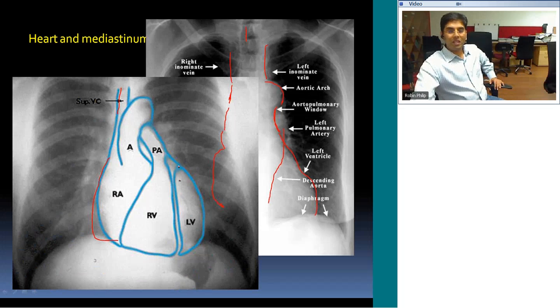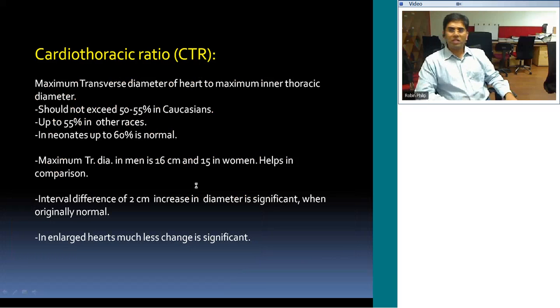Unless it is enlarged, we cannot make that out. The left heart border is formed by the left ventricle, and the heart apex is formed by the left ventricular apex. And you can see the pulmonary artery. That's where the pulmonary bay was there. Okay, corresponding cardiac anatomy.